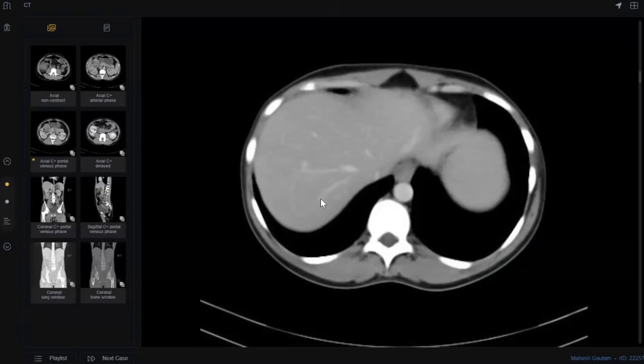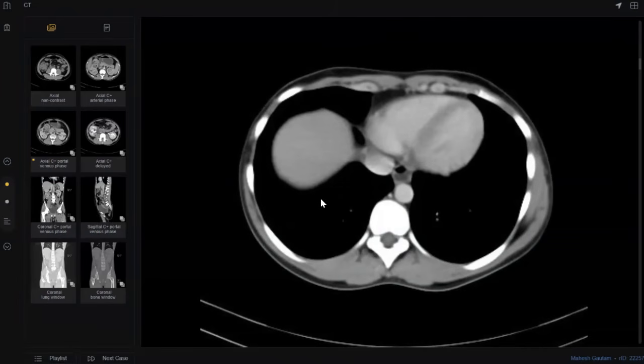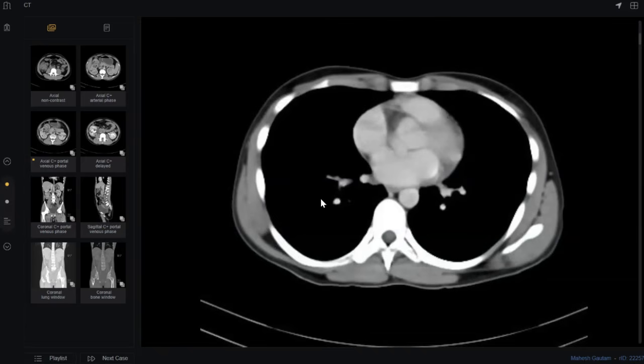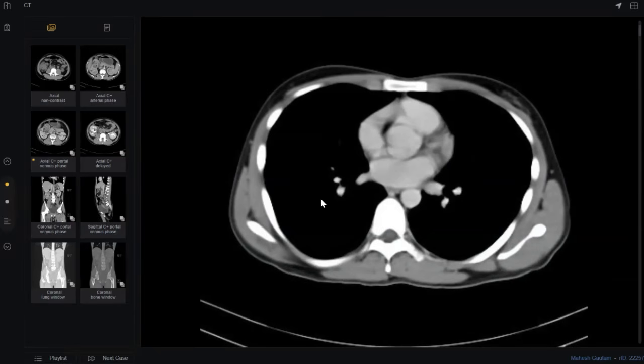My final diagnosis is this is a retroperitoneal hemorrhage, which has extended to the peritoneal space as a result of a ruptured angiomyolipoma, one of the angiomyolipomas which has bled. This is an emergency. This will need urgent referral to the on-call surgical team as well as interventional radiology for urgent embolization.